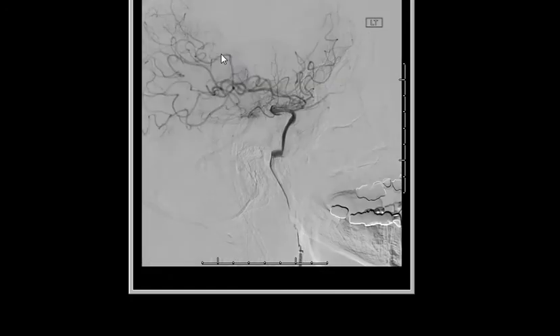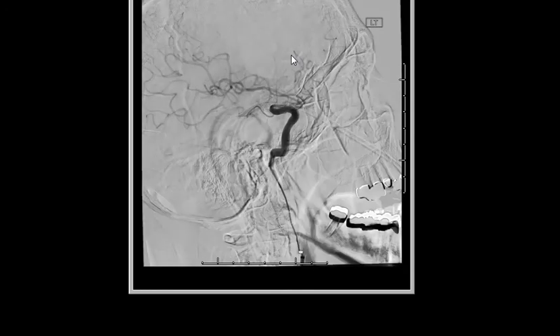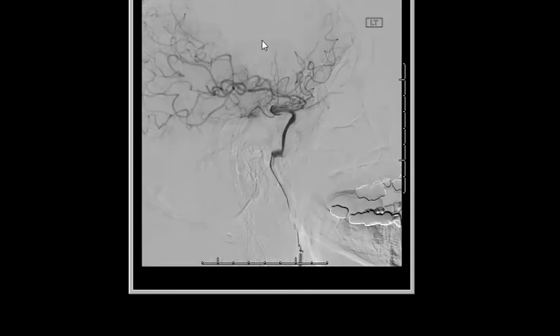However, a large portion of the brain was still not perfused, and we couldn't find the clot responsible for that occlusion. But I guess we got at least half of the MCA territory back.